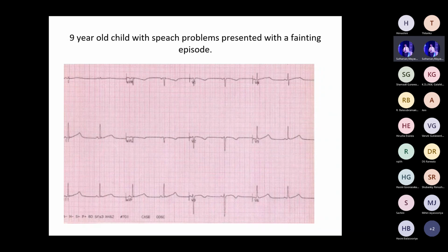What about QT interval here? Do you think it's normal? So long QT with speech problems. What is the problem? Why have I included speech problems? Long QT with sensorineural deafness. What is the condition?